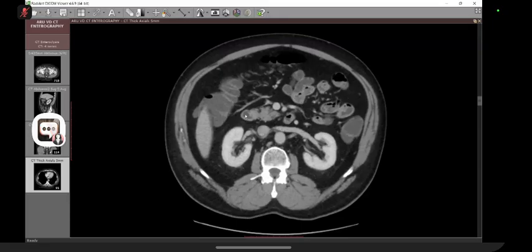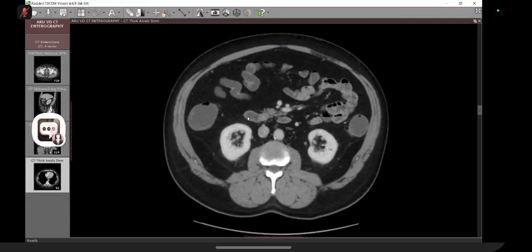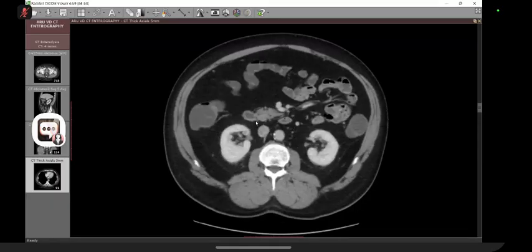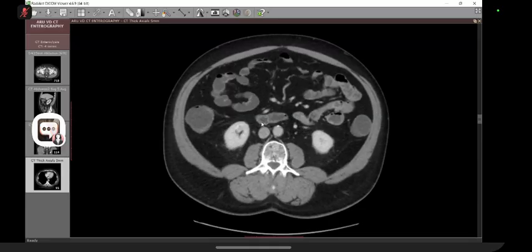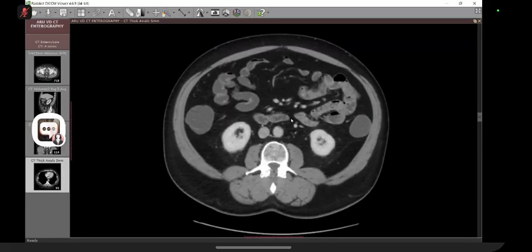Now just concentrate on D2. As I'm going distally, this is going to turn 90 degrees to the left side. It has to cross the midline and go to the other side. So this is the D3. So I come back. This is the D2, and then this becomes D3. It goes to the other side. Now D4 is going to ascend up.